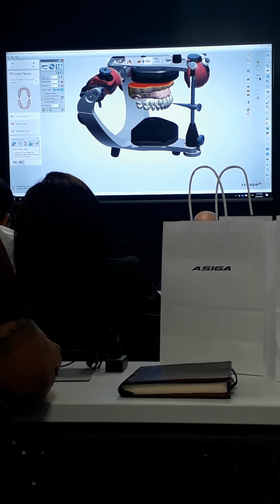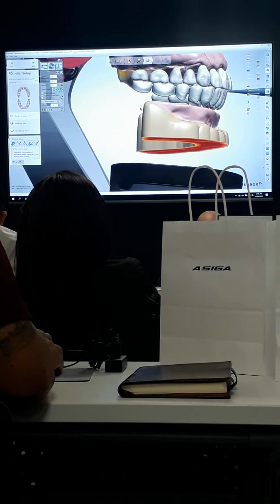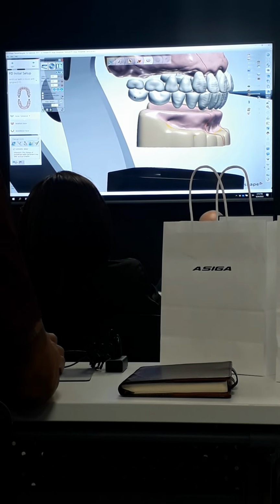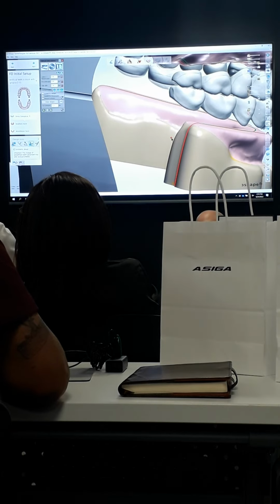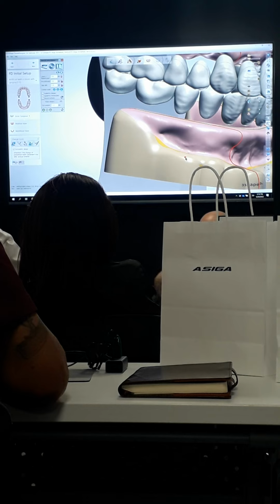A good example is here. Obviously, I don't know what's here, so I don't even know if I can do a denture tooth right here. So I'm going to take this lower molar out, just so there's no issue. Obviously, my base ends right here, so that tooth wouldn't work in the first place. Can you extend it? In that sculpt step in the prepare area, I could have added a whole bunch of material back there, but there's no guarantee that it's accurate, so I would tend to just not. And this is also a try-in, so it's not a final denture, so there's no point in doing it.